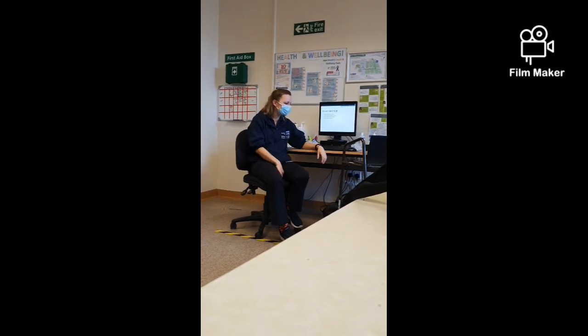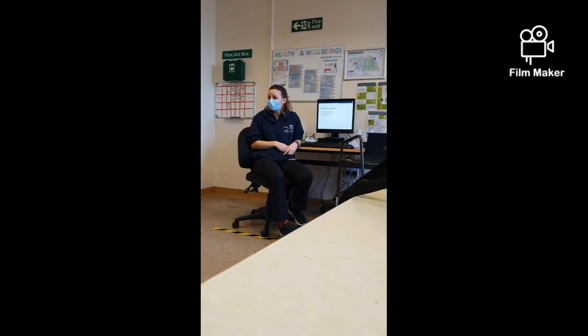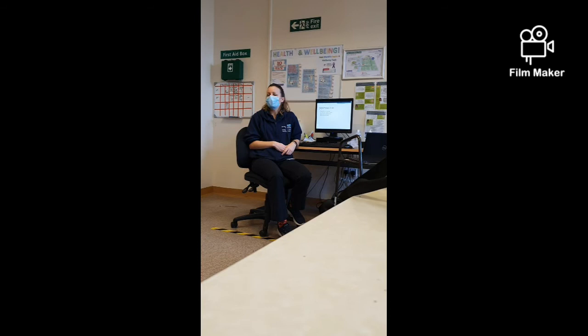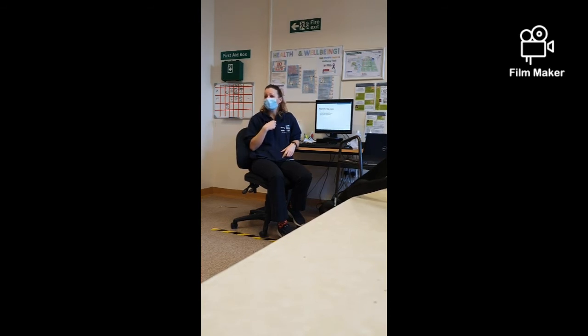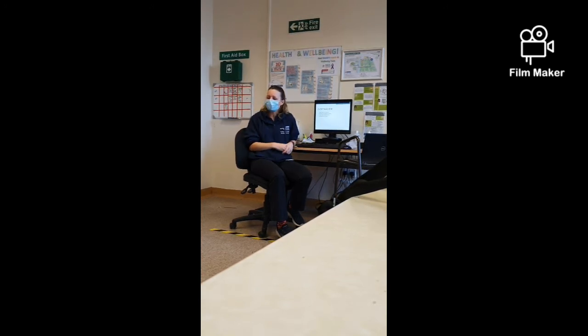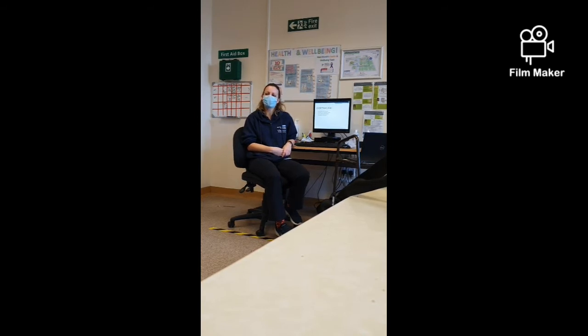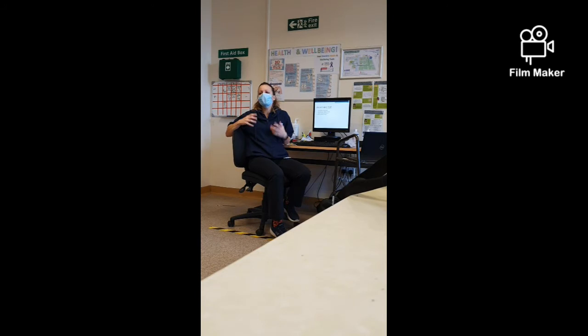Yeah, attachments, gadgets. So what might show up on a chest x-ray? Pacemaker, yeah. Your oxygen tubing, if you're on intensive care or on the surgical ward, an NG tube would also show up on a chest x-ray. Okay. What else might you look out for on a chest x-ray? If you think of maybe some trauma patients, yeah, rib fractures. Okay, and then other things that you might want to look at.